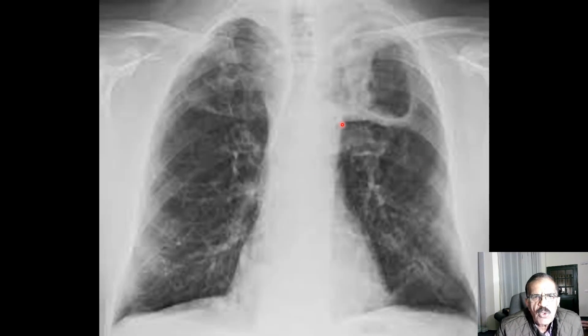Now this is more typical of tuberculosis. There's a big cavity here, but this is surrounded by an opacity which is occupying the left upper lobe. A fibrotic process, inflammatory process or consolidation with a cavity inside in the apex is very suggestive of tuberculosis. Definitive diagnosis would require sputum for AFB, but if the patient has long-term fever and weight loss, I think this X-ray could be taken as diagnostic of tuberculosis, given in the proper context.